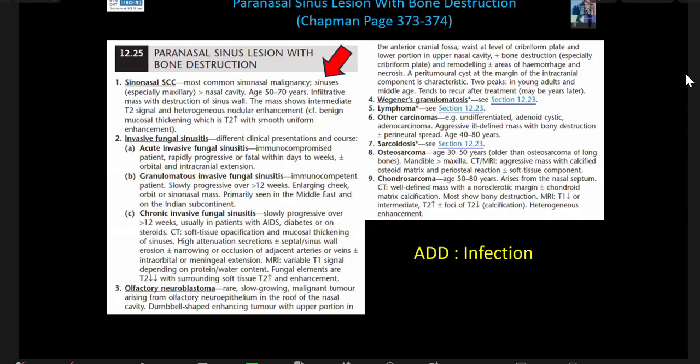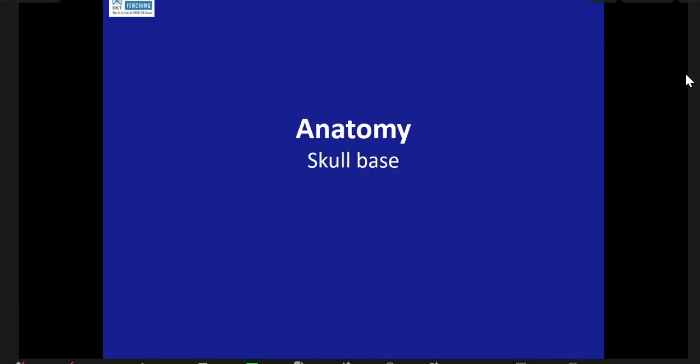Now, this was a squamous cell carcinoma. Once you know what the epicenter is, then it becomes quite easy. This kind of case, and I have selected many of these kinds of cases today, where findings are quite obvious, but the whole of the viva in the exam will be the grilling of anatomy. What is this? Where is it going? What is happening? That kind of thing. So it will be a big lesion, but the question and answer will be on anatomy.